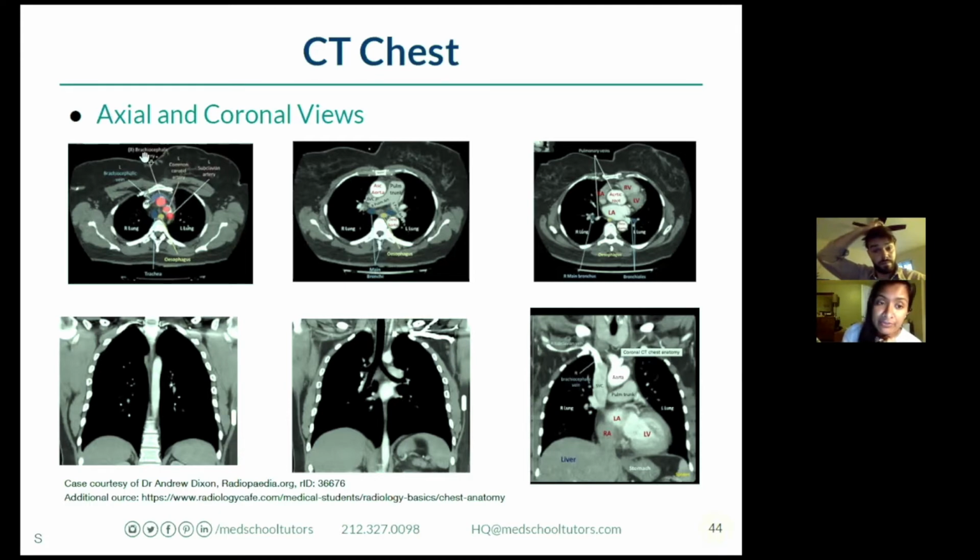And here you have the three arteries, brachiocephalic, common carotid, and subclavian, coming off of the aortic arch, right? Here again, see the trachea coming down, and that'll be black because it's air-filled, lungs on either side. And then we have the esophagus as well.